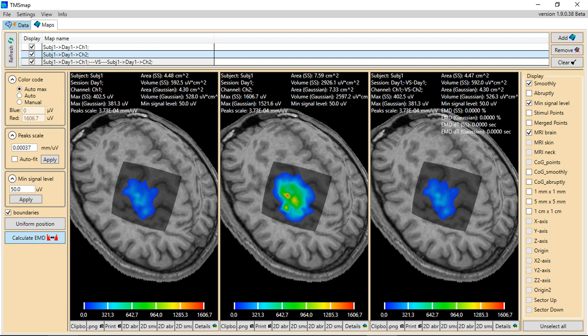It takes a couple of seconds, and you can see here EMD when we base the smooth change in function assumption, it will be 4.53, and with another assumption it would be 4.53, but a bit different.